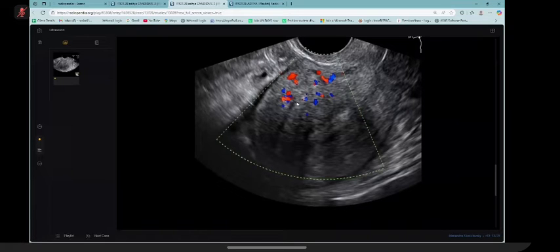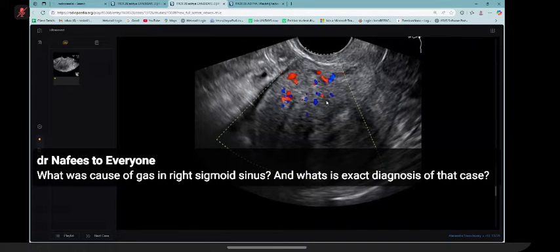Other differentials in this case would be developing fibroid along the anterior myometrium. So I will inform the findings to the referring gynecologist and suggest referral to the gynecology team. Also would suggest MRI of the pelvis for further confirmation of my findings.